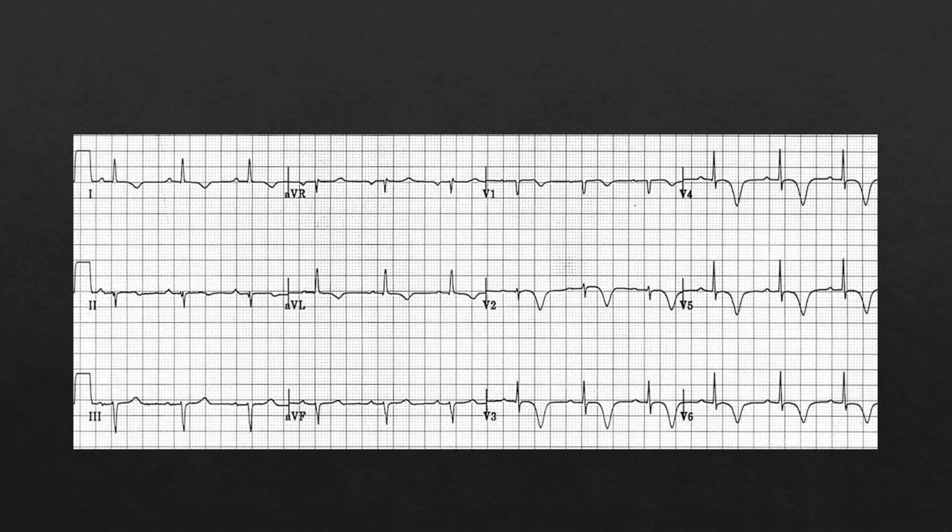You'll see similar types of patterns like this in other things. So you can see this in rare cases with patients with raised intracranial pressure, with certain strain patterns. It's important it needs to be tied to the patient presentation. So this presentation of ECG in a patient with ACS symptoms that have resolved abruptly or dramatically reduced, that is very concerning.